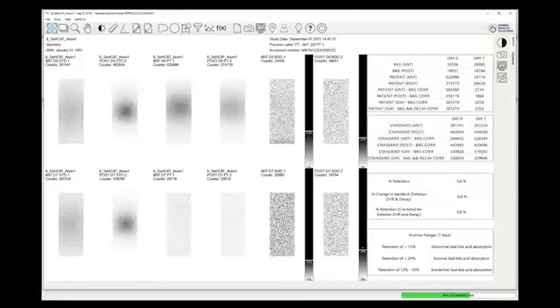I mean, they all look pretty good. Maybe that top left one might have a slight stripe happening at the bottom, but it's only small. So yeah, we just looked for this to see if there was any patient walking past during the acquisition. Oh, you can see that on the other too. So that B key can be used to get the color bar going on any of the images.